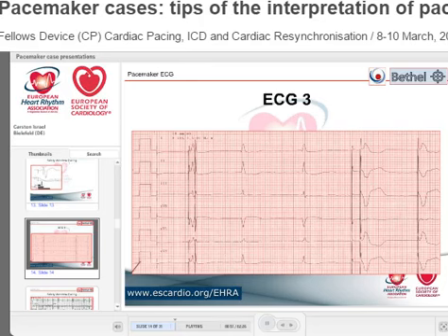If you program the paced AV delay to 110 milliseconds, you didn't listen to some of the speakers who are trying to teach you that you should not use short AV delays because you should avoid unnecessary ventricular pacing. So if you have programmed this AV delay, you didn't understand the course completely and should repeat it. So this must be an automatic algorithm. Why is here safety window pacing? Atrial spike, QRS, ventricular spike.